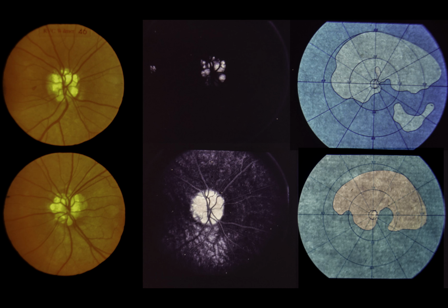Lower center. 30 minutes after injection of fluorescein, dye molecules have attached to the drusen, causing late hyperfluorescence. Upper right. Initial visual field in the right eye demonstrates an arcuate defect. Visual acuity at this time was 20/25 right eye and 20/15 left eye. 4 years later, visual acuity in the right eye is 20/40, and the visual field has worsened, lower right. Drusen may compress nerve fibers in the prelaminar portion of the optic nerve, causing atrophy of the peripapillary retinal nerve fiber layer and a progressive loss of visual field and acuity.